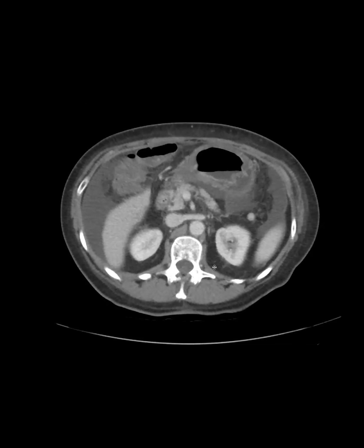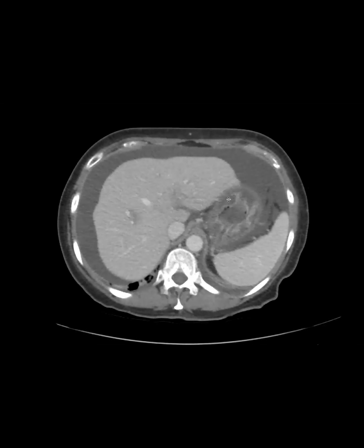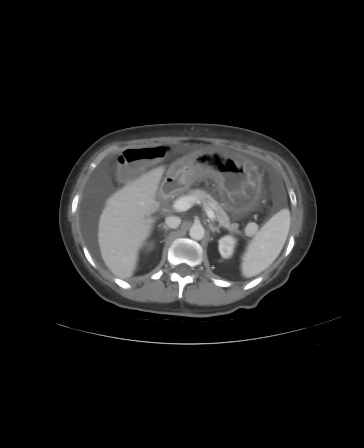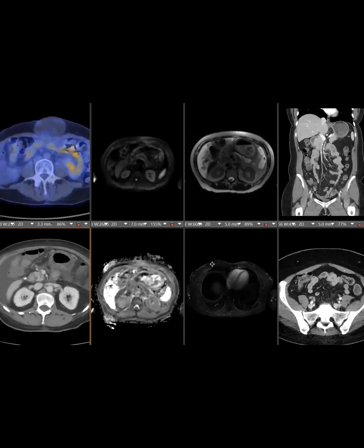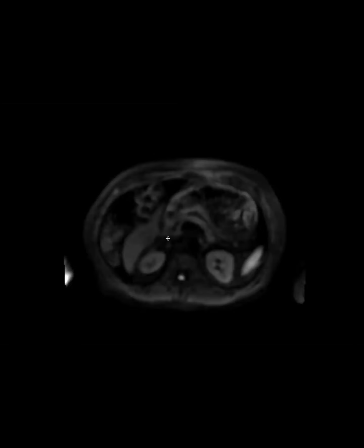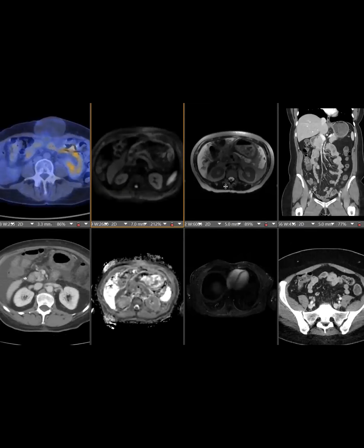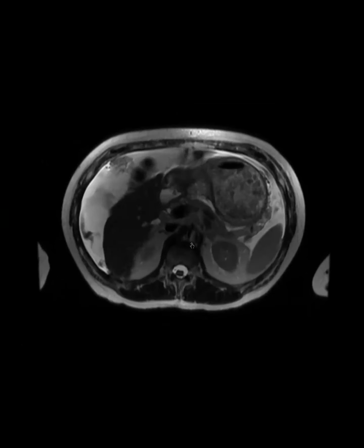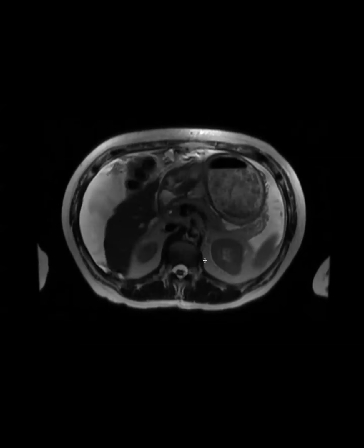Okay, go ahead, Nelly. So after the chemo-radiation, the patient had radiation-induced gastritis, pretty significant. You can see here, and the patient was followed and scoped. I forget what the indication for the MRI was, but the MRI was done. And here I wanted to show a nice MR PET correlate for a finding that I think is only really best seen by MRI and subsequently by PET.